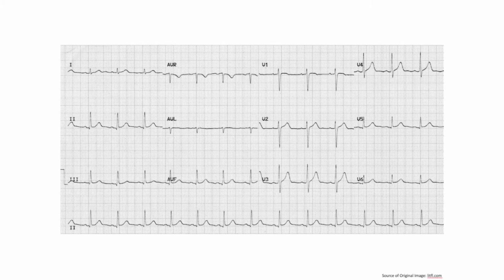Now, in terms of reading an EKG, there are 4 basic steps, and when you're trying to read an EKG, always make sure you're doing these 4 steps in every single EKG you read. That way, you would minimize the chance of missing something that is not so obvious. Also, if you can master the art of knowing which EKG is normal, figuring out the abnormal parts would help you reach the ultimate diagnosis. So, in essence, what you want to do is go through the 4 steps, look at which parts of the EKG are normal and what the deviations are, think through all the abnormalities, and come up with the diagnoses that would explain all the abnormalities you're seeing.